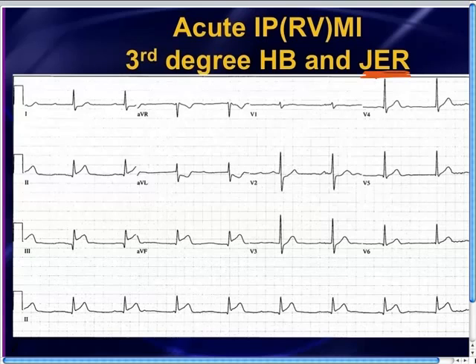myocardial infarction. All right, and when the final interpretation was actually correctly made on this patient, the patient was up in the cath lab. After the cath, the patient continued to have a complete heart block, and so the patient ended up getting a pacemaker. Fortunately this patient did go up to the cath lab because of the inferior MI, but had it not been for the inferior MI, this complete heart block could have been missed because people were relying on the computer, and that dumb computer was looking at the wrong things. The computer was saying, this is just a normal sinus bradycardia with the rate in the 50s, don't worry about it.